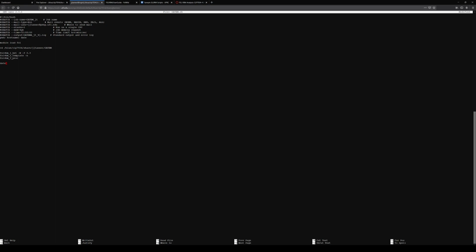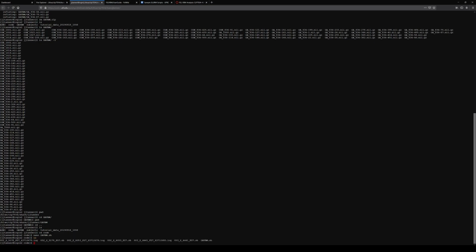And I can put this script in that code directory, because in here I have cd. We go into the proper directory to run this. And then I can save it, so Control O will save it, and then Control X to exit. And so now if I list, I can verify I have an OA-VBM.sh. And now I can submit this as sbatch OA-VBM.sh.